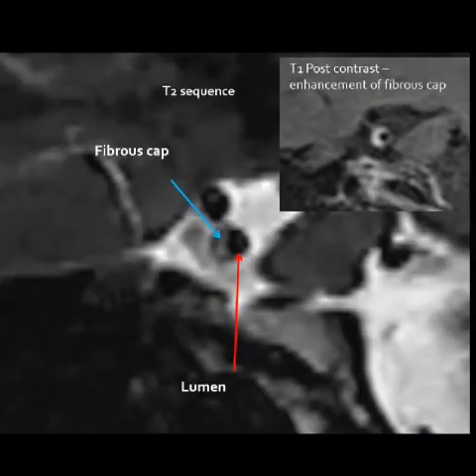Look at the sagittal T1 post-contrast imaging. There was eccentric thickening and enhancement that was grade 2, that is equivalent to the pituitary stalk. Whenever there is confusion between atherosclerosis and vasculitis, it is important to look at the T2 sequence.